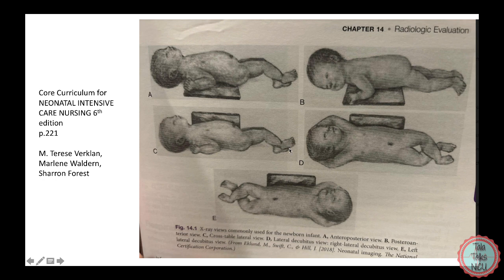And another slide that explains X-ray positioning. This is AP, so again, anterior-posterior, and then this is PA. We very rarely get this view since infants are nearly always on their backs.